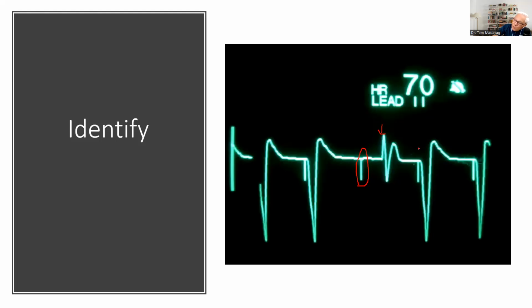Yet, the pacemaker fired right here, which means that it did not detect this QRS complex. So therefore, there's both loss of sensing as well as loss of capture.